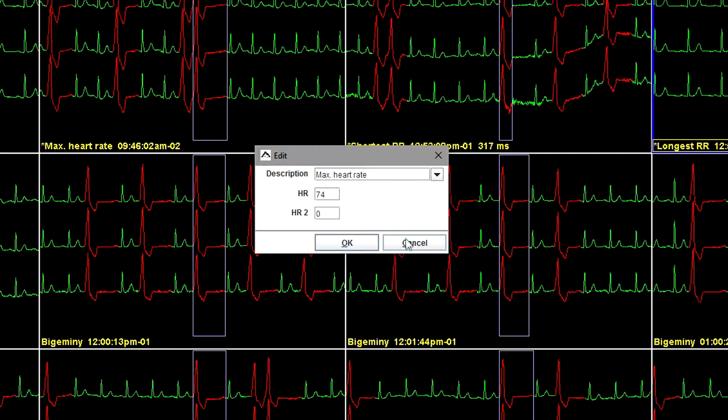If you type the entry, the autofill feature appears. As you type, the characters are matched to the preset list and will automatically fill in. If the text that appears is not what you want, continue typing the entry until it displays appropriately. If the label you want is not already on the preset list, you must type the entire entry. Once the correct label appears, press Enter. When you have completed your changes, click OK to save those changes and exit. Click Cancel to exit without saving any changes.